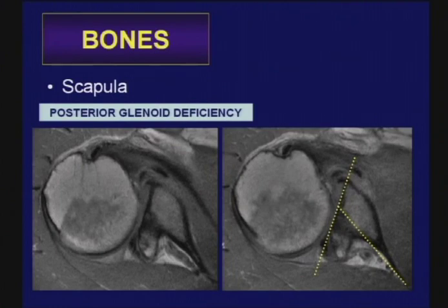Severe osteoarthrosis of the glenohumeral joint is encountered. Years ago, we said it was extremely rare. I think that was not correct. In general, in my experience, most of the time when you have severe OA of the glenohumeral joint, the humeral head migrates in a posterior direction.